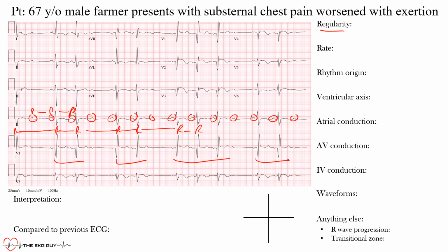So you're kind of dealing with an atrial rhythm that is regular, and then a ventricular rhythm that has some irregularity to it. So for the atrial, we'll call it A, and then ventricular V. Okay, the atrial will be regular, and then the ventricular, in this case, we'll call it irregular.